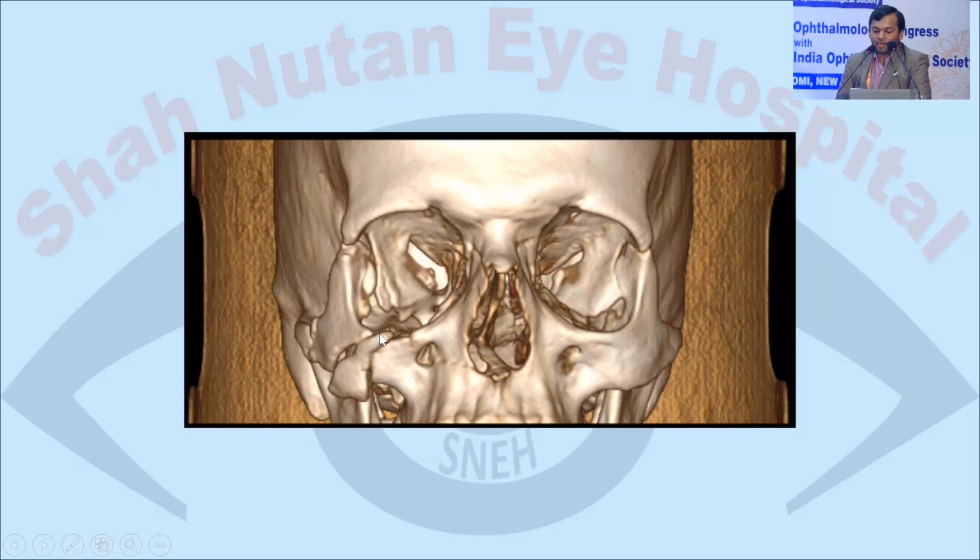Here we have a displaced fragment of the zygomatic arch, and there is a fracture alongside it of the lateral wall and the floor. Hence we need to plan a lateral orbitotomy with a swinging eyelid crease approach to access the floor of the orbit and have adequate exposure of the zygomatic arch as well, to fix the tripod fracture as well as the orbital fractures.